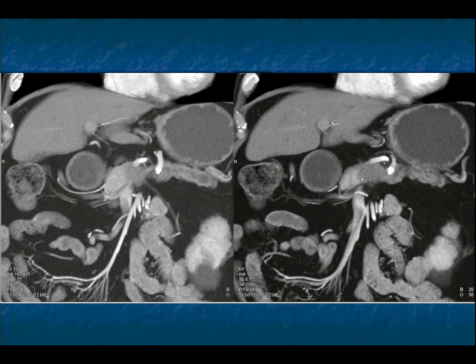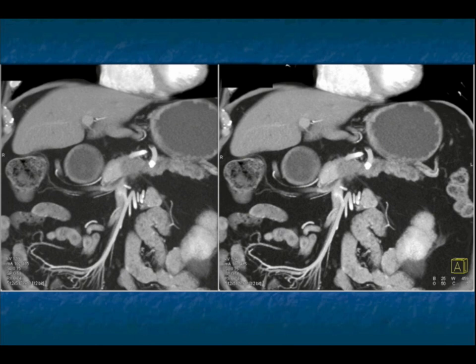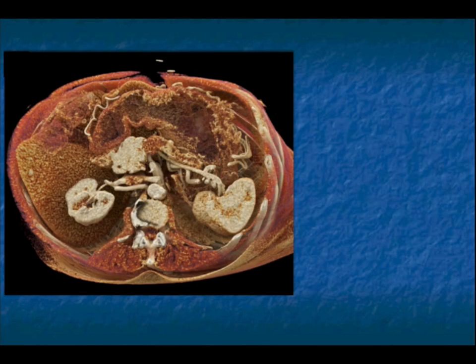The other thing we find out is when we looked at missed cases of pancreatic cancer, one of the most common findings that's overlooked is that duct cutoff, and invariably the patients will then present another 6 to 12 months later, where the patient initially might have been resectable, they're now going to be unresectable. Again, looking at textural changes as well as the dilated pancreatic duct, it's very obvious in this case precisely where the tumor is. I do like doing reconstructions along the plane of the duct, so in this case you can see exactly where the dilated duct ends and what the cause specifically is.